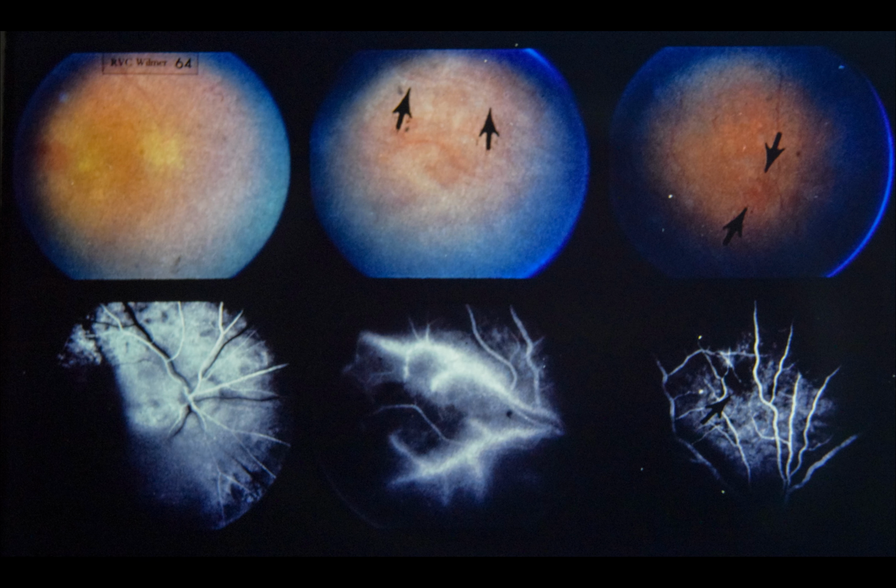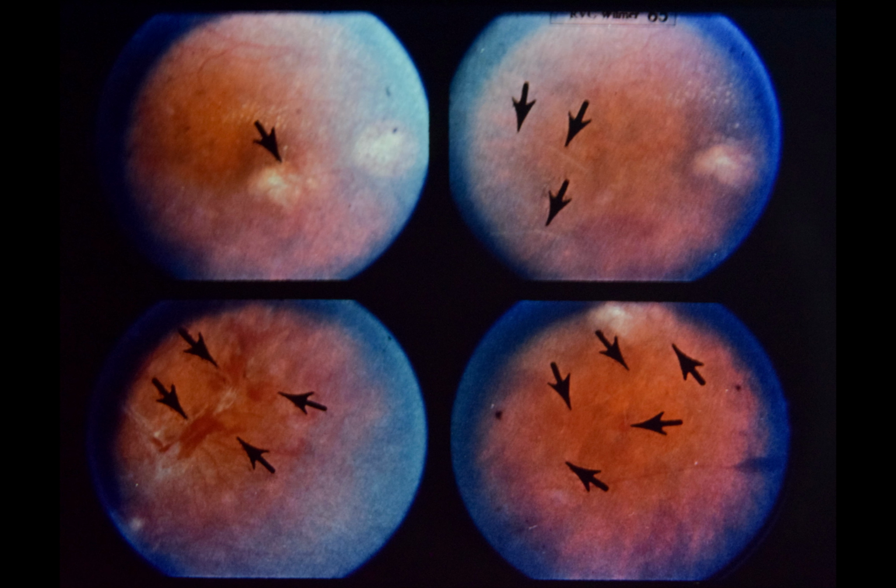Comment: this patient began with toxoplasmosis and eventually developed a picture consistent with Eales disease. He demonstrates peripheral vascular occlusions, secondary neovascularization, and intravitreal hemorrhage. The original infection may be unrelated to the final clinical picture.